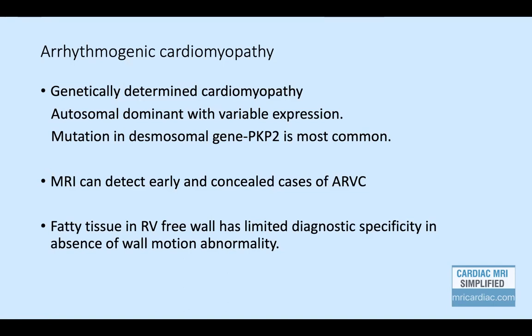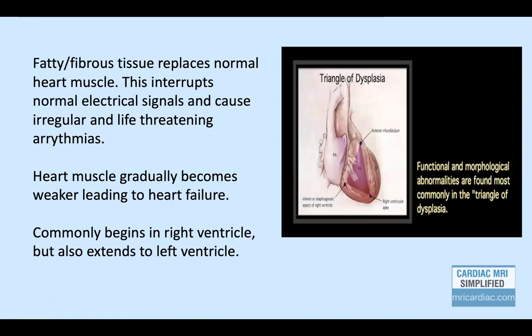The clinical presentations may be highly variable, but MRI features with RV ejection fraction, end diastolic volume parameters, and segmental dyskinesia are highly characteristic, and it can detect these cases. Initially, it was thought that fatty or fibrofatty tissue in RV free wall is diagnostic. However, now we know that fat in the myocardium can occur even in normal patients, hence it is not considered diagnostic, and without wall motion abnormality or functional parameters, this should not be considered as diagnostic.